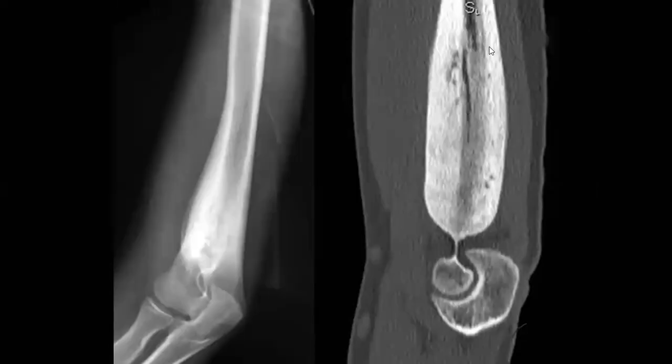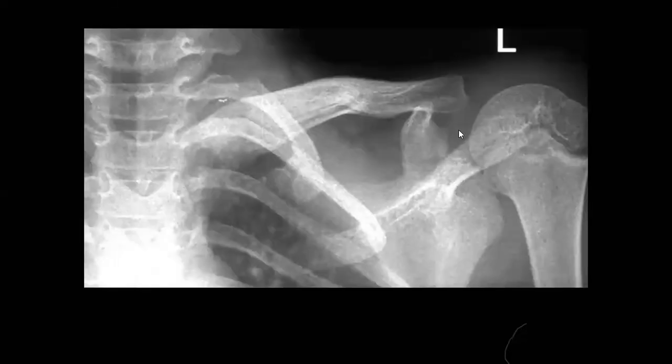So this appearance is hyperostosis with osteitis. When you have SAPHO, you should mention CRMO. What is CRMO? Chronic recurrent multifocal osteomyelitis, which we already mentioned. It likes the medial clavicle. So when you see the medial clavicle, especially if it is bilateral and symmetrical, he wants you to say it is chronic recurrent multifocal osteomyelitis.